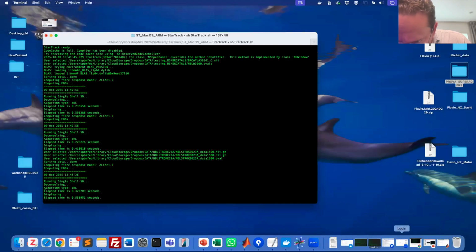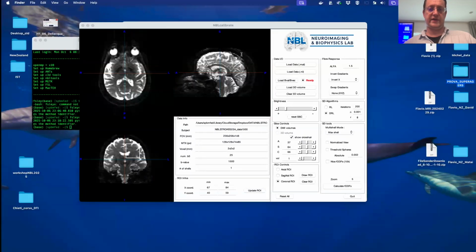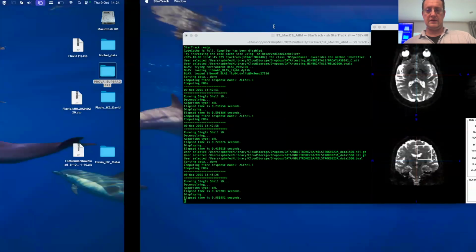Should have it somewhere. Where are you? Oh, I see. Okay.